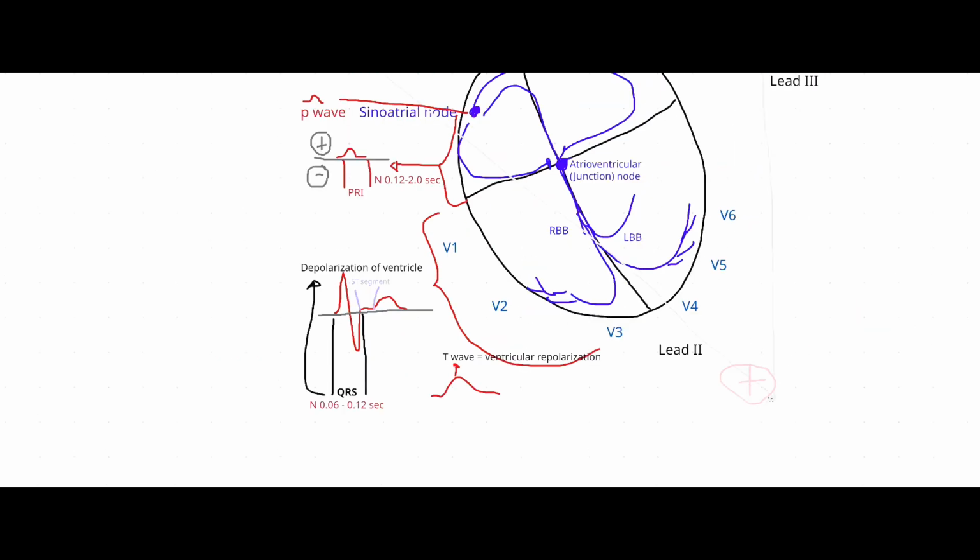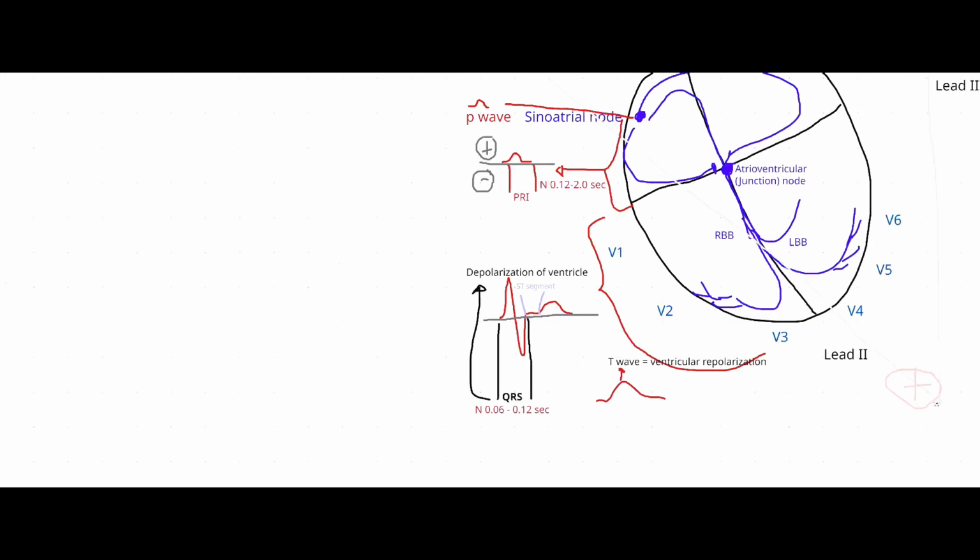Remember, the higher the wave, the more positive the energy. That means that there's electrical flow, okay? The higher the wave, there's higher flow of electricity. Let's write that down. Some concepts, okay? And then I guess I'll do the squares too now. So the horizontal line equals time, okay? How long something takes.